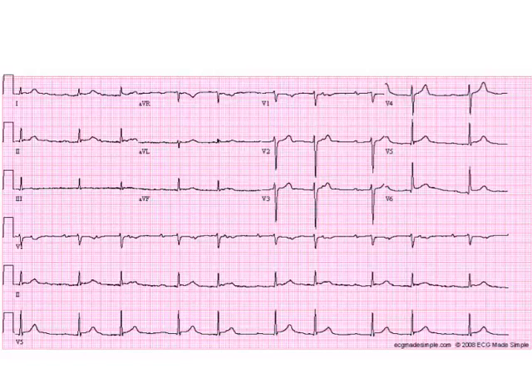This is an ECG of a 58-year-old man who was referred to the cardiac clinic by his general practitioner. Let's look at the ECG. Looking for P waves, they are probably easiest to see in the lead V1 rhythm strip.